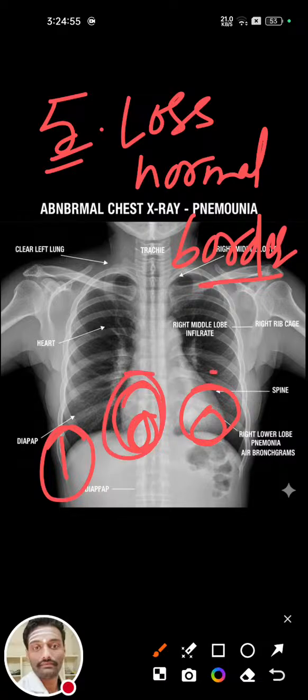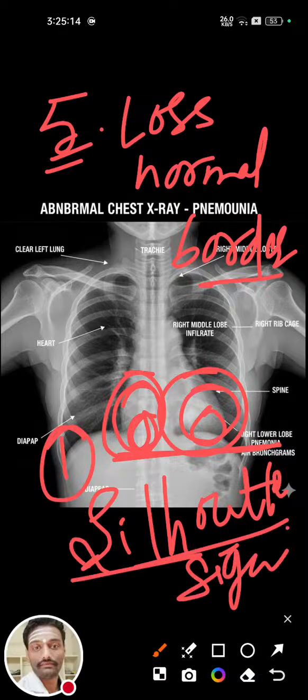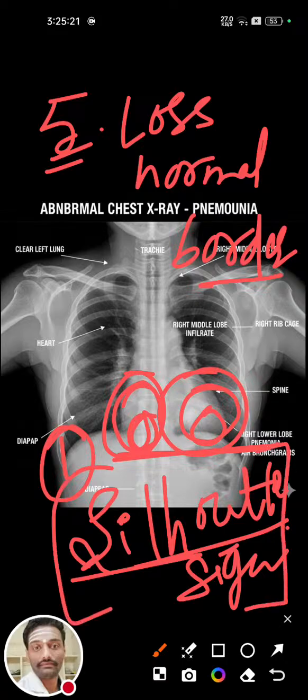Okay, these are very important in checking the borders of the heart, very important. These are all explained in the silhouette sign. Remember, I am telling you a second time, these are all explained in the silhouette sign. If you have any doubt in the silhouette sign, you can ask in the comments.